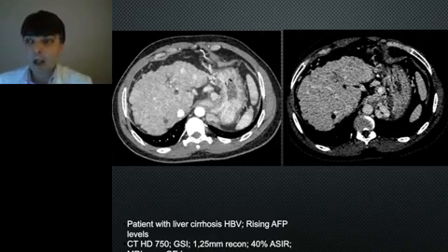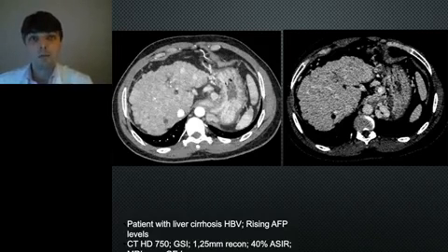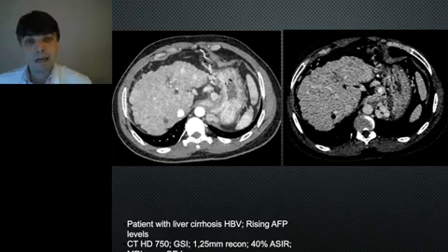Well, you can detect contrast enhancement if you're able to reduce the energy levels and demonstrate that you have iodine within your tumors. And in this patient, there were clearly two small sub-centimetric LI-RADS 4 lesions that were clearly hyper-enhancing on the virtual reconstructed low energy level, and this is the 50 keV level, where you can see those lesions.